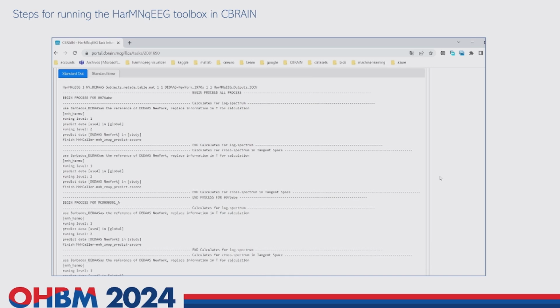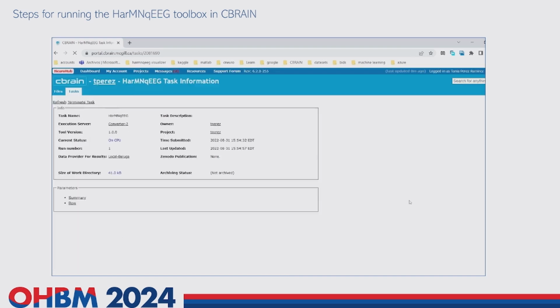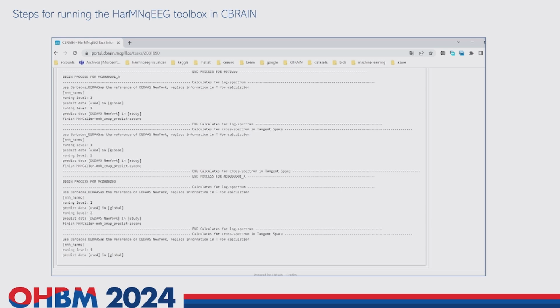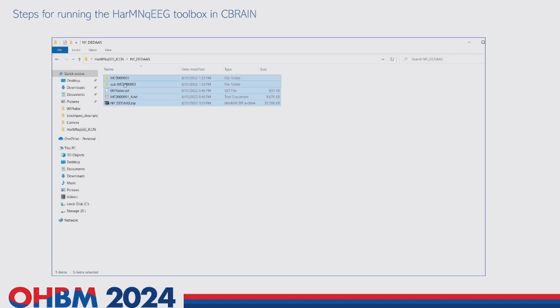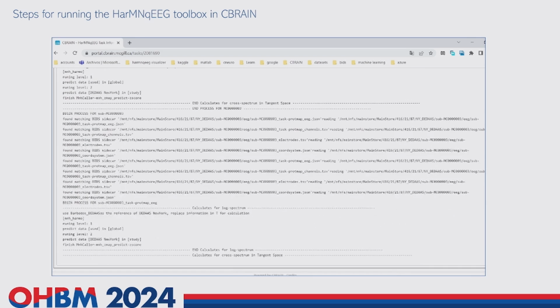So you see, this is just showing all the subjects. Are you ready, Ibrahim? This takes a little more time than qEEGT. qEEGT is very fast. And okay, it finished with all subjects. It's giving you all the information.